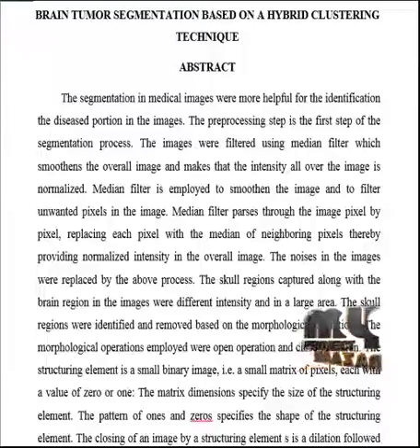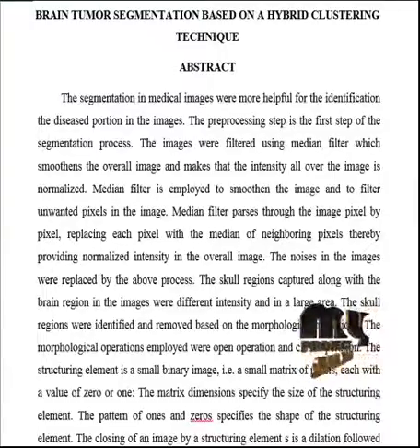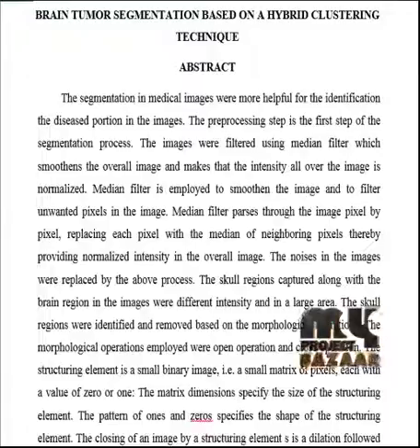Skull regions captured along with the brain region in the images were different in intensity and larger in area. Skull regions were identified and they were removed based on morphological processing. Clustering process is then applied based on the KIFCM clustering process. The regions in the images that had similar intensity were clustered using the KI fuzzy image algorithm.